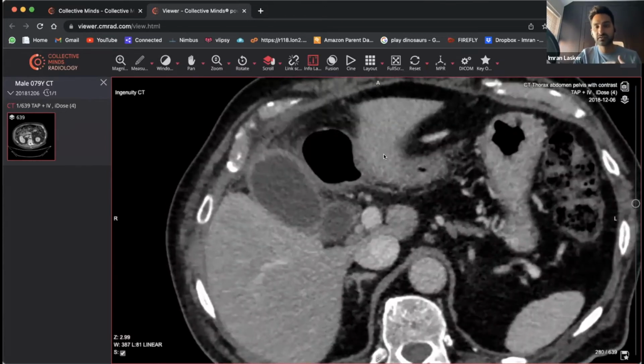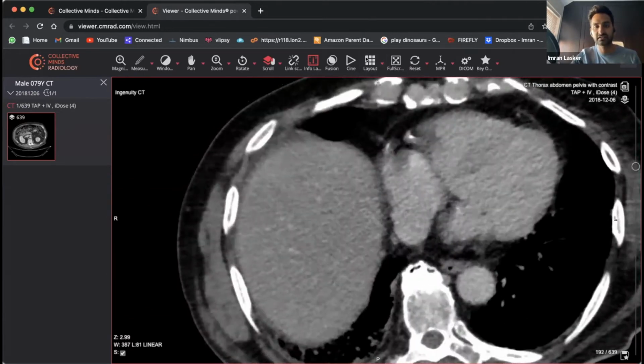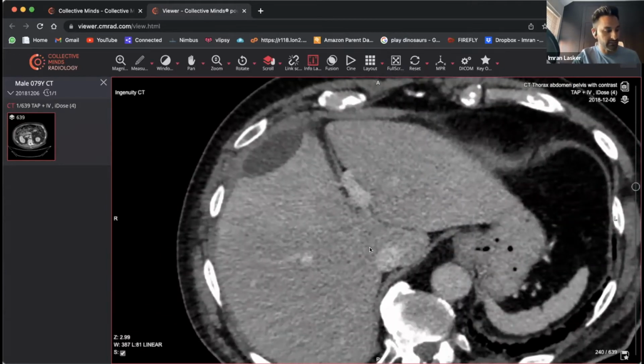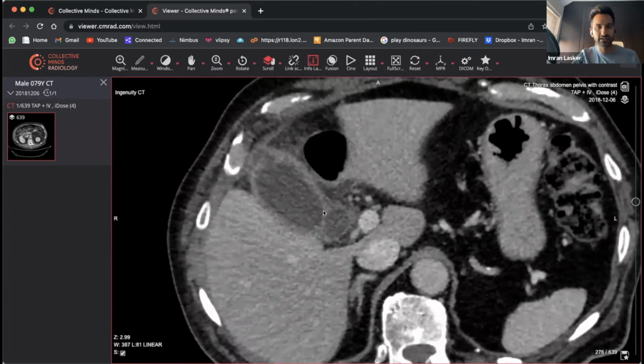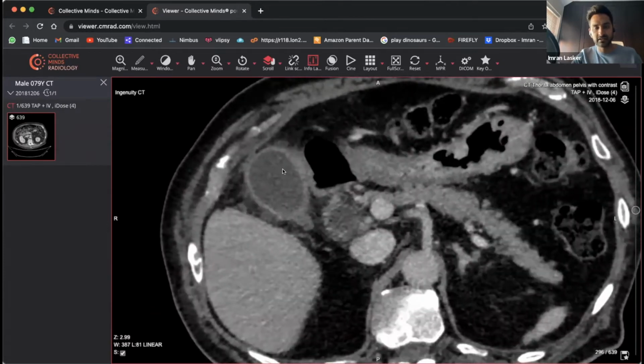But in this situation, we don't have anything that looks like intrahepatic duct dilatation, nothing convincing anyway, or not anything that we'd be particularly concerned about. But now, as we come back to this gallbladder, which clearly doesn't look quite normal, you can see that there is some fat stranding located there. As you scroll further down, you've got the body of the gallbladder, and it goes down to the tail.